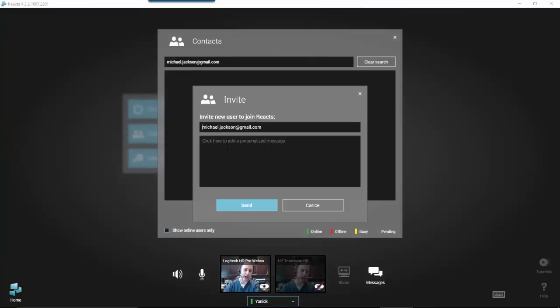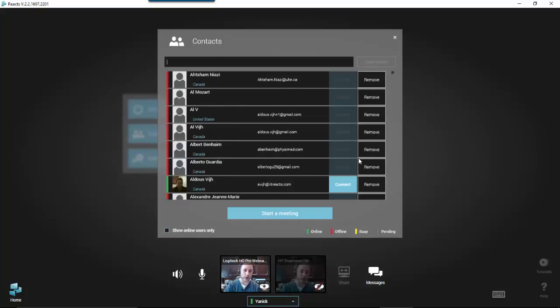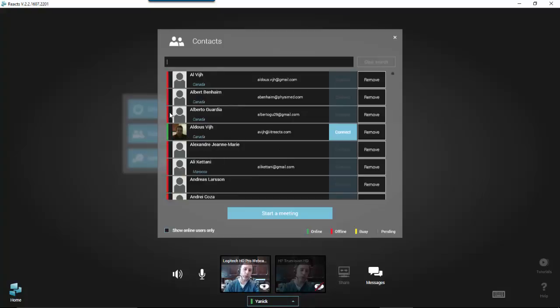I could then type a message and click send, and the other user would receive a request for invitation. They have to accept it to confirm that they want to connect with you. You will see them either offline in red or online in green, in which case you can just hit connect and start a session. Okay, and we'll connect with my colleague Aldous in a second.